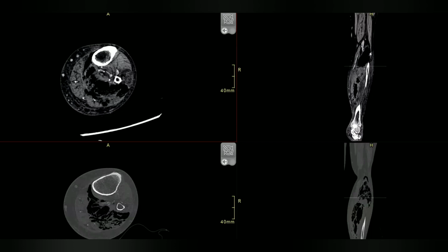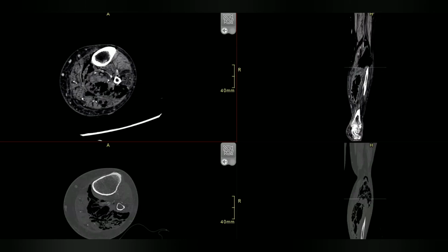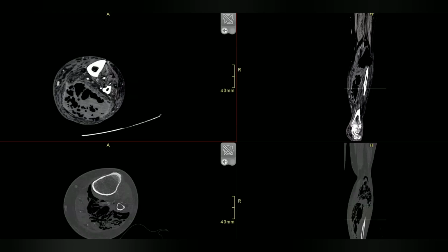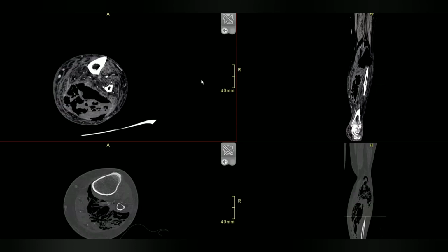Okay, but what's your diagnosis? I am again suspecting soft tissue abscess formation. You are suspecting what? Sorry. Soft tissue abscess. Okay, so you did a very good attempt. Very good, excellent. So this one has no differential. Number 1, 2, it's an emergency. And this is an entity that you can see anywhere, and you need to be aware of it.